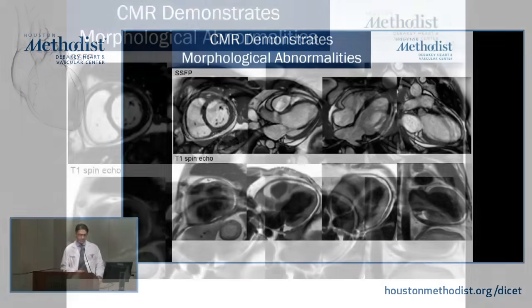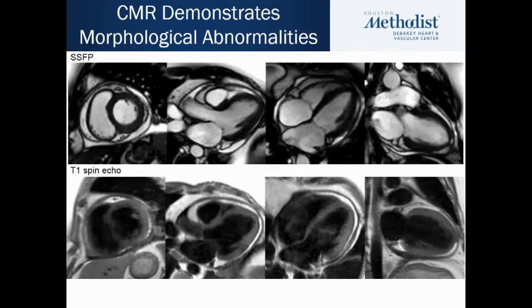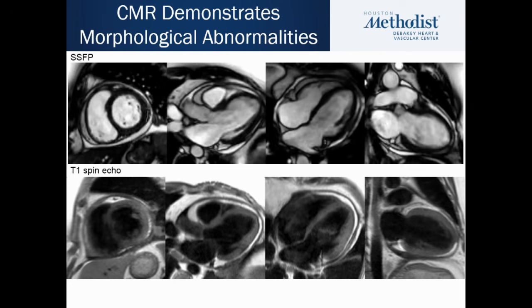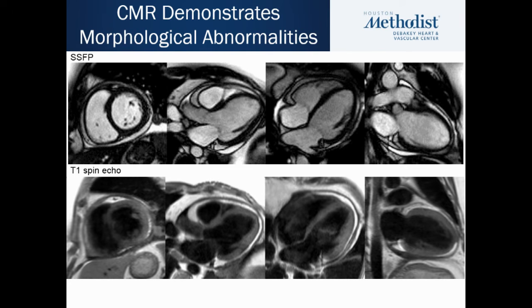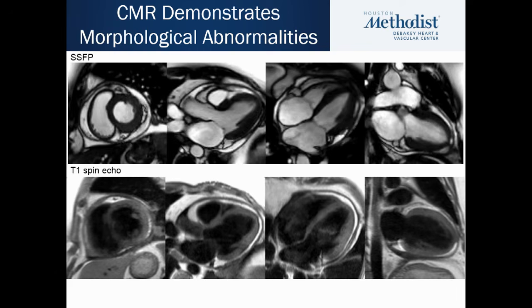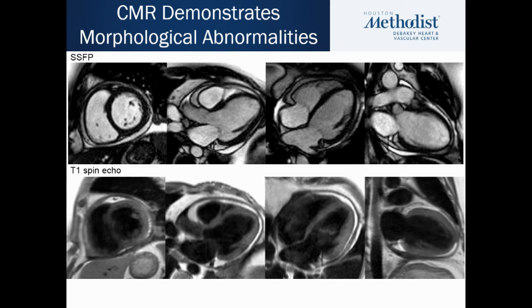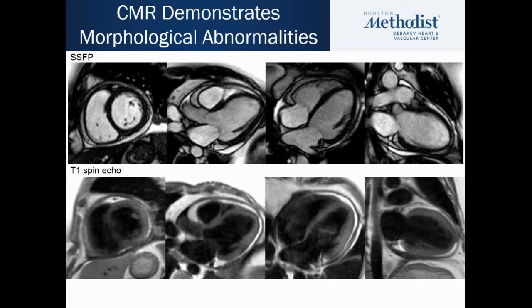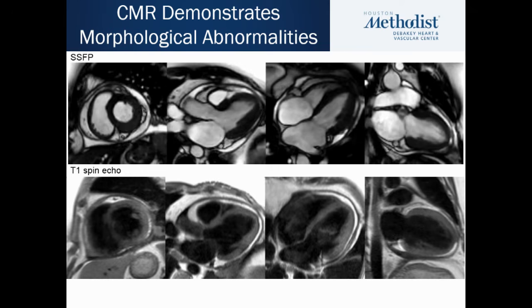So this patient had a CMR done, and this was the heart here. I just want to demonstrate what the CMR findings of constriction are. So first of all, morphology. With CMR, you can look at the pericardium. So with our turbo spin echoes, I hope you can appreciate now, I've shown you many examples of this, a nicely thickened pericardium all around the heart.